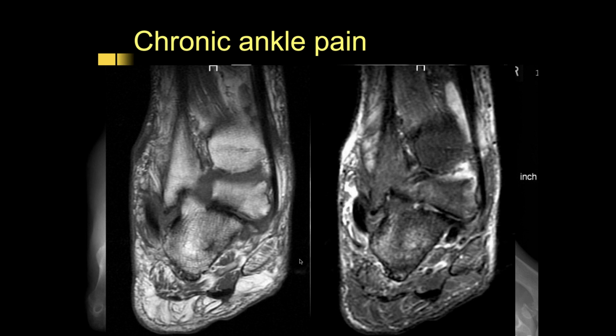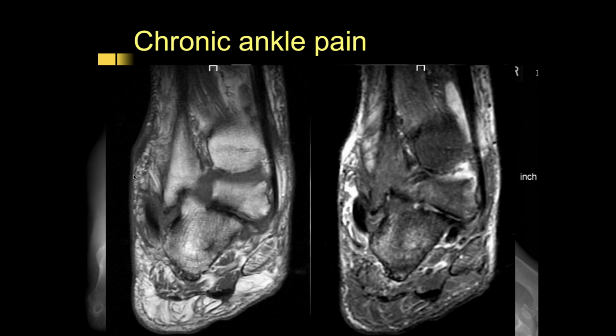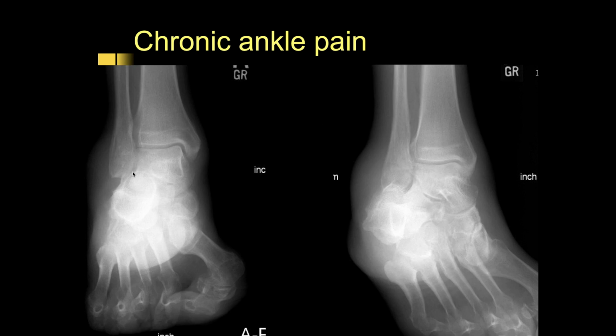So what we have going on here, from the single cut, this almost looks like we have severe advanced lateral hindfoot impingement. Okay, if we go back, it's not that easy to see on the plain film. Yeah, I was wondering about that oblique, because you have impingement between the distal fibula and the calcaneus laterally and maybe a hindfoot valgus.